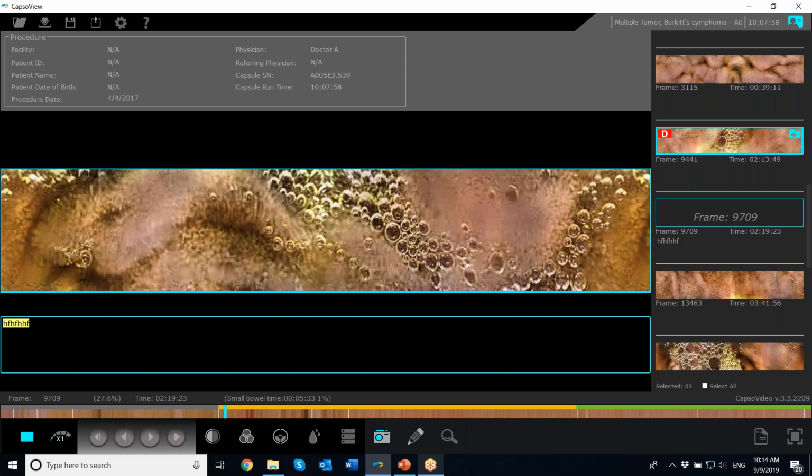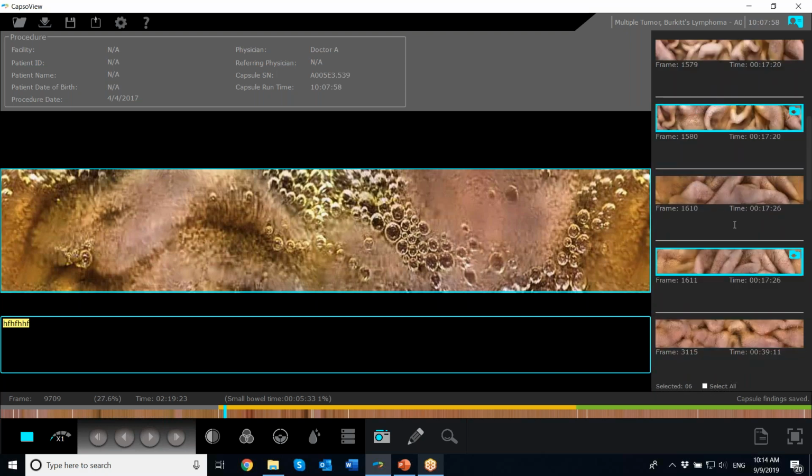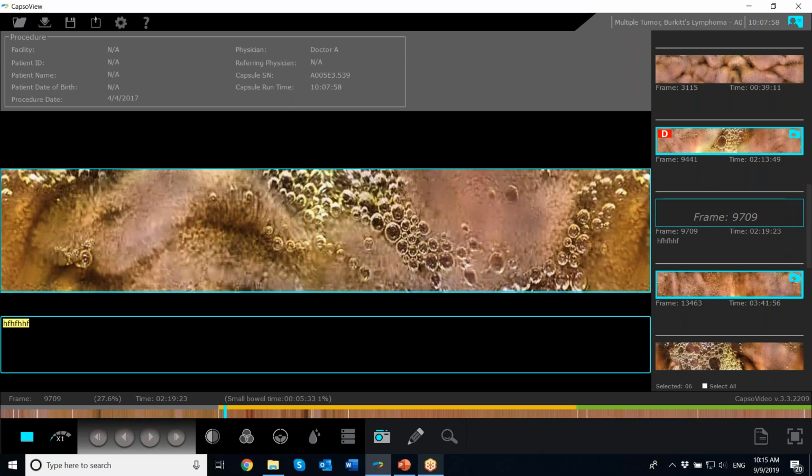All right. So the next one is image selection for report. To include all captured images in the report, click this. See, this means that this picture is added to the report. So you can pick actually all of them or any of them you want. And it will turn blue. And that's how you will know that these pictures will go to the report.